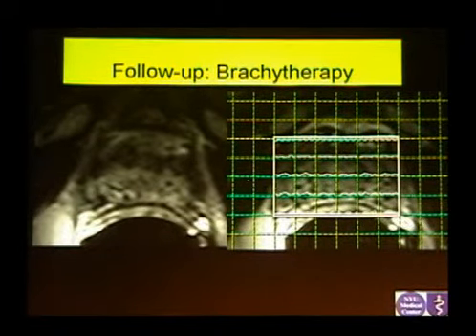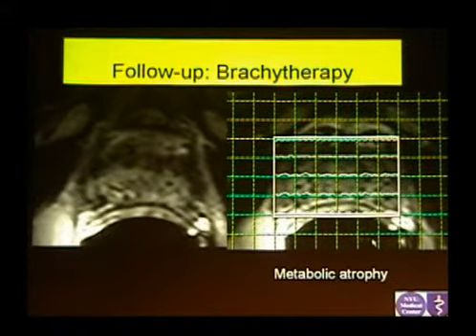So a patient has spectroscopy, and you see there's no metabolism, basically it's just flat. This is called metabolic atrophy. The prostate shut down completely. So the 2 other options you're going to see with spectroscopy in patients with recurrent PSA after radiation therapy: it could be metabolic atrophy, which is good. It could also be what we call metabolic recovery, where you see some citrate reappearing, which is normal, kind of. So the prostate is coming back to work, basically. And sometimes the worst scenario will be choline peaks, meaning that there is some cancer coming back.